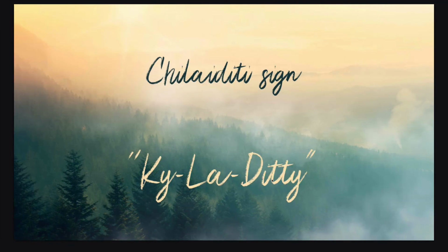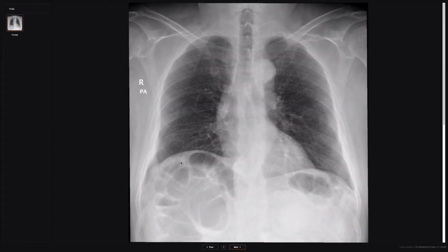Now, there's just an important thing to be aware of that is often a mistake made when people interpret chest x-rays for pneumoperitoneum, which is Chilaiditi's sign, a pseudo pneumoperitoneum. Okay, so Chilaiditi described this, and it's essentially when you've got air which is within the right upper quadrant beneath the right hemidiaphragm, between the diaphragm and the liver, but it's not free air, it's air which is actually within bowel loops.